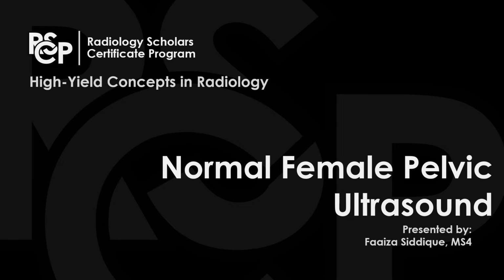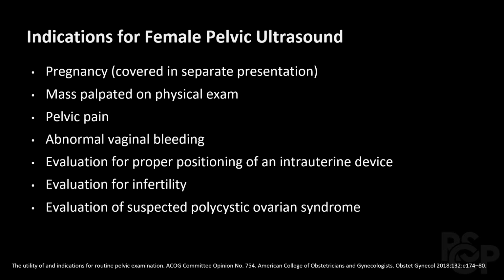Welcome to a presentation on normal female pelvic ultrasound. There are many indications to obtain a female pelvic ultrasound. Pregnancy will be discussed in a separate presentation.